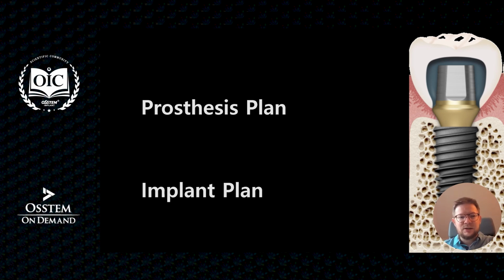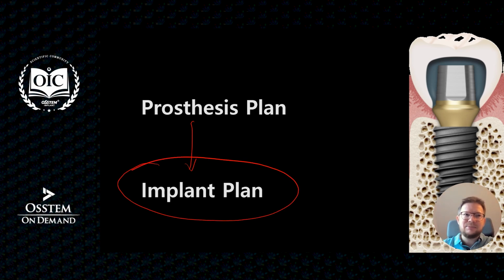To go ahead, I will start with backward planning, and this is the concept of planning implants from the final results to the planning. It means that first we plan the prosthesis shape, size, and position in the oral cavity, and to this prosthesis we place an implant in the CBCT data, the cross sections, in the position which will be appropriate to support that prosthesis.